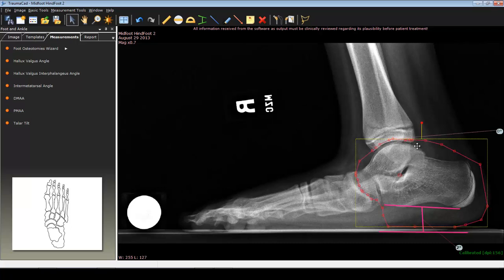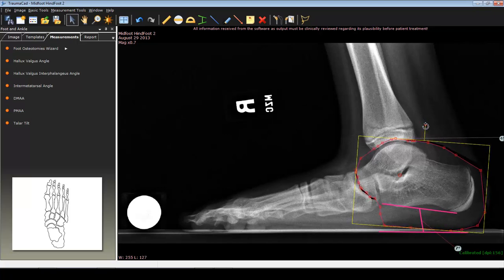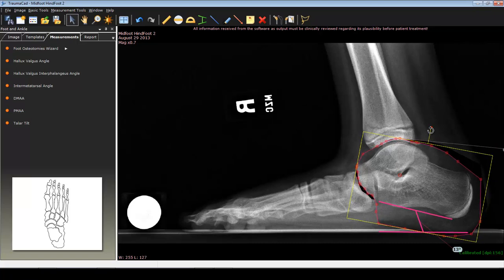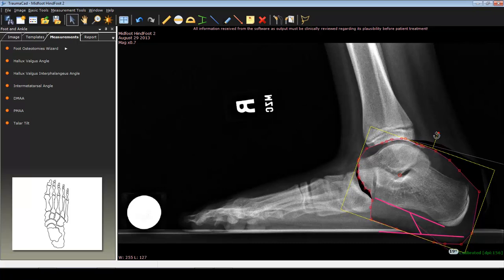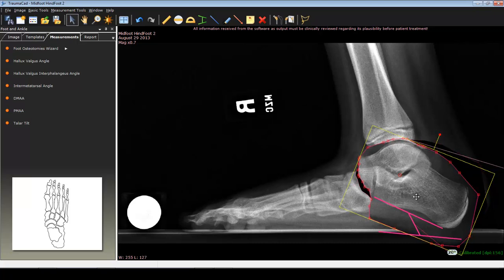And let's do that. So if you click our fragment, you come up here and grab the handle. Let's correct this ankle. So we said at least 15 degrees is normal. So let's get to that 15 degrees. And as you can see, as I'm rotating, this ankle starts to look more normal. Right about 18 degrees, we're like, okay, so our talus is starting to have a more normal inclination. And let's keep going. I want it to be a little better. I want this patient to have a little more rotation. And now we're at 20 degrees. We split the difference between 15 and 24. And I'm much happier with this. Now we have a 20-degree calcaneal inclination, and the ankle is in a much better position than it was before.